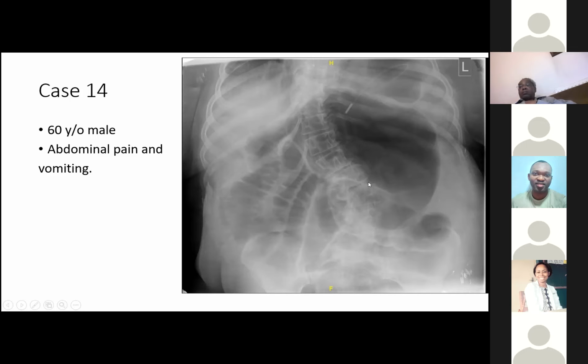But ultimately, it doesn't matter that you don't spot that it's a cecum. If you come up with saying that this patient has got bowel obstruction, the next test is without doubt a CT scan, and that's going to show you the answer. If you can pick up the fact that there's abnormally distended bowel, that's probably good enough, because then you pick the next appropriate examination. Any more questions on that one?